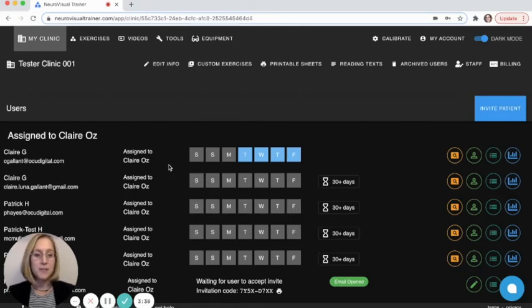Here, what an active patient means is that they are shown here, and so they'll be receiving treatment probably from you. They might have some assigned exercises over here, and you'll be able to see the reporting. So through here, you'll be seeing the progress reports.